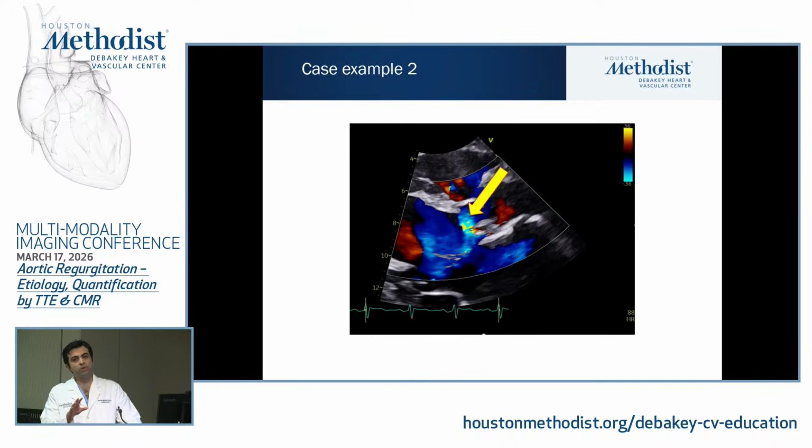And the sonographers can add to this. In our protocol, what they usually do is get a big overview of the left ventricle, and then they put a big box on the aorta, the aortic and the mitral valve. If they see something, they zoom in and focus on it. If they don't see anything at all, they may just suffice with this. So it becomes a little bit dependent on the patient. But you see examples like this, it could be missed if you're not paying attention, with just a big box that doesn't cover.